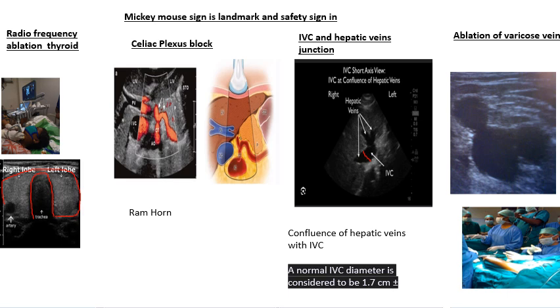Your idea was to be only at the saphenofemoral junction. If you injure important structures, they are going to thrombose. We don't want that. We want only thrombosis just below the junction or at the junction, and thrombosis of the saphenous vein. So let's have a look why it is called Mickey Mouse sign.